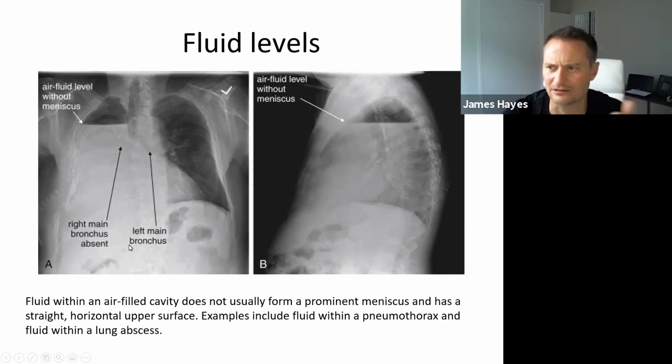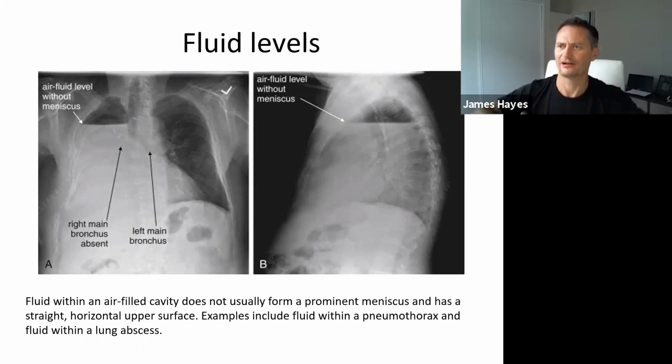This is a lung full of lovely air. And so the air wants to push down. You can't see what I'm doing with my hands. I'm kind of going like that. The air wants to push down, so it's flattening that meniscus.